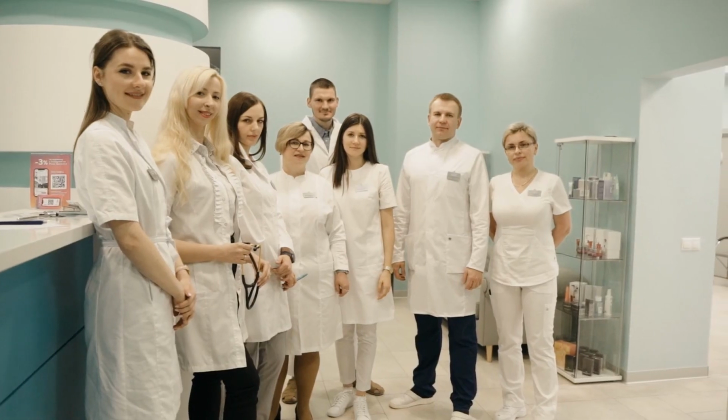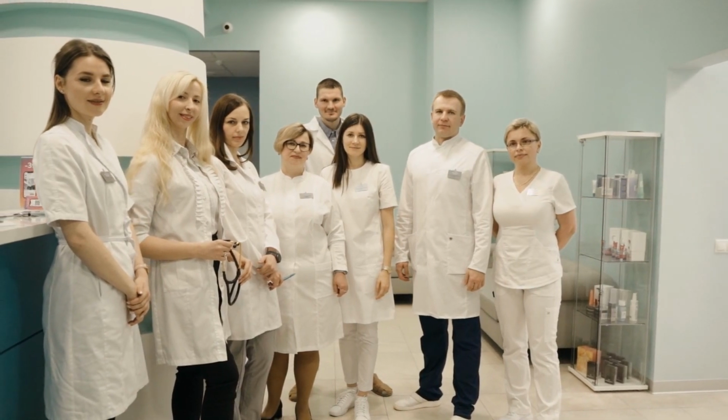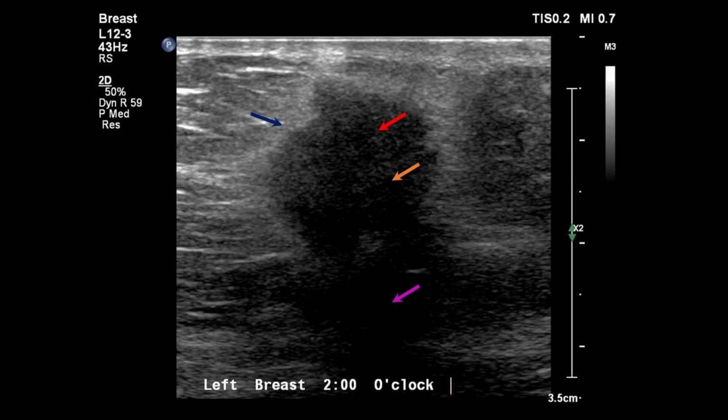Alright, let's talk about ultrasound, but without making it sound like a boring textbook, shall we? It's like trying to understand why your phone takes such great pictures. First off, we have these things called acoustic enhancement and shadowing. Think of them as the lighting tricks of ultrasound. Enhancement is like a spotlight behind a fluid-filled area, making it look extra bright and showing us stuff like cysts. Shadowing is the opposite, creating a dark zone behind something solid like a gallstone. It's like when a rock casts a shadow on a sunny day, making it easier to spot.